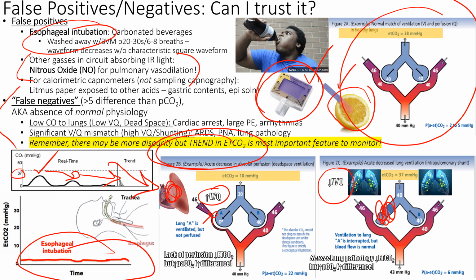Will CPAP seal over this? What's that? CPAP will seal over this? No, CPAP is a little bit wonky. It's not like a BiPAP machine over the end-tidal CO2 cannula. It's not as accurate. There's not a great way to sample off those guys.